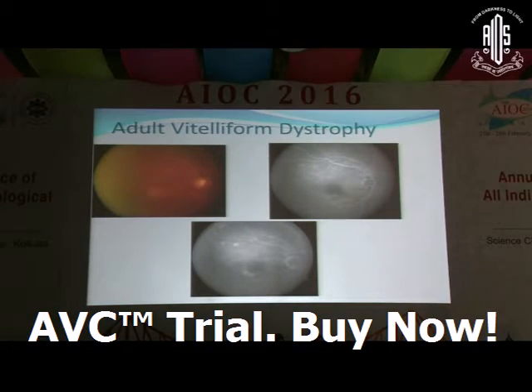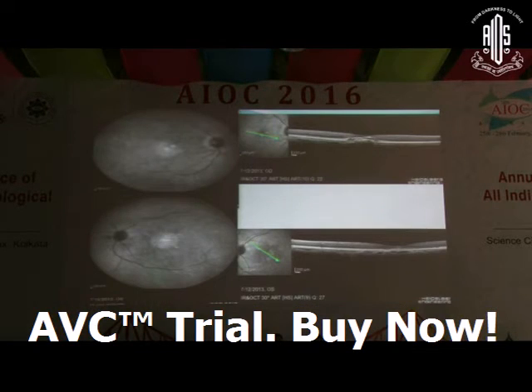Coming to the next disease, this is adult vitelliform dystrophy. This usually presents above the age of 55, and these yellowish lesions occur because of the disintegration of the photoreceptors. On fluorescein angiography, it usually gives an appearance of a block fluorescence. In the same patient, we did an OCT. You can see there is a thickening at the layer of RPE, and there is a slight amount of fluid.